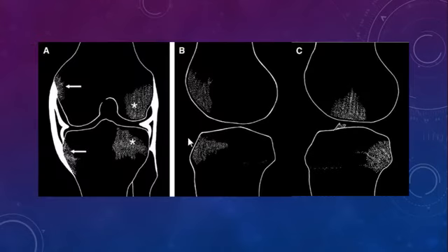As in this diagram, you can see the different types of bone contusions. Here, it's the type of bone marrow edema that results from avulsion fracture. It's small and localized to the site of the avulsion. While here you can see impaction fractures. These are contiguous kissing contusions that usually happen during extension injuries. They are adjacent or opposite each other. While here are the non-contiguous contusions which occur during translation during the acute injury. They are not opposed to each other.